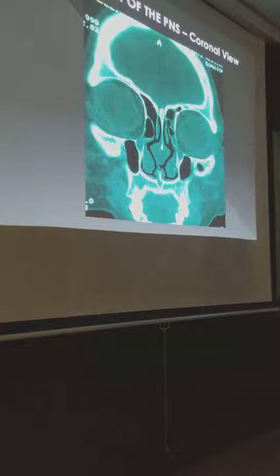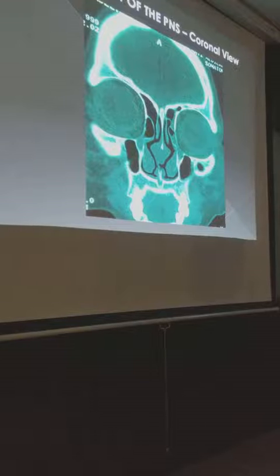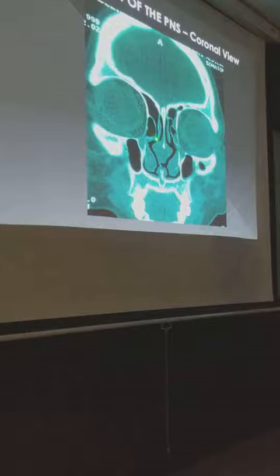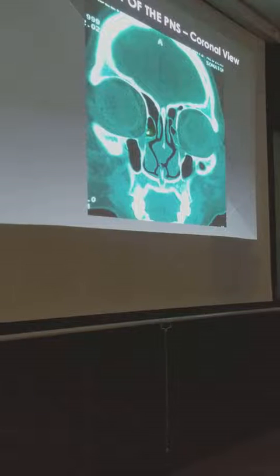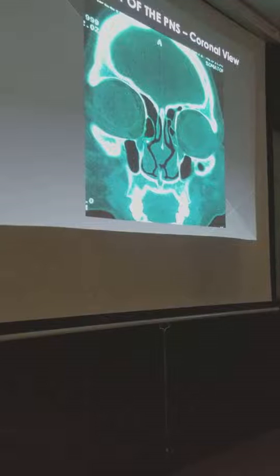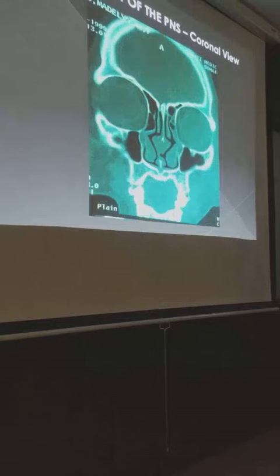So if you notice, if you do an endoscopic dacryocystorhinostomy, you have to understand that you will have to pass through the agger nasi, right? Because as I told you, the lateral wall of the agger nasi is also the medial wall of the fossa. So some people, once they enter here, think this is it. But you have to understand that you still have another wall, which is this one, to penetrate, to be able to do your dacryocystorhinostomy. Alright? So I just wanted to show those are just the extended, the next back to the.